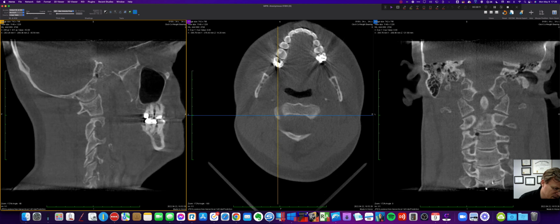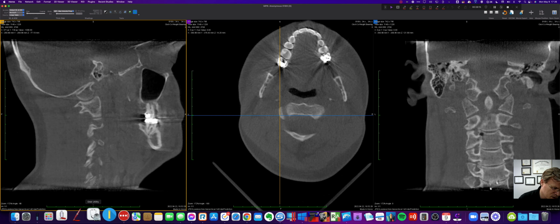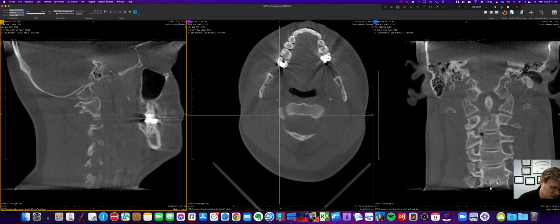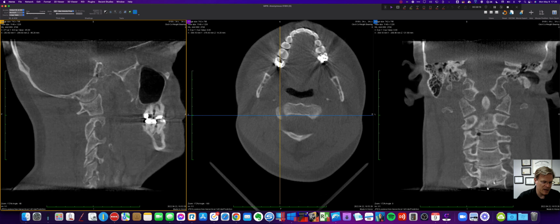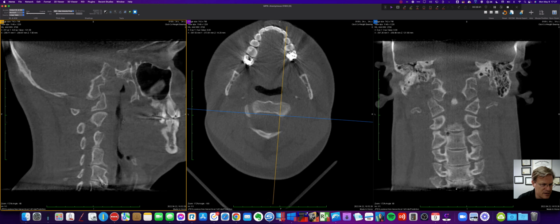And C5 looks similar down here. It's not a smooth, easy joint, but that also looks pretty bad. So let's find the kind of best picture or pictures. Take a picture of it. Okay, let's see, he's a little rotated, so now let's go look at the other side.